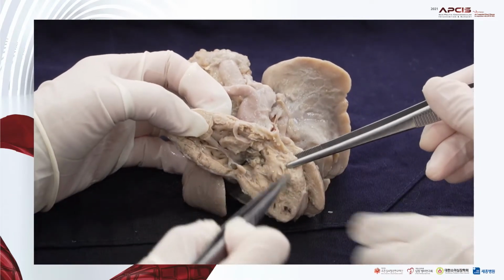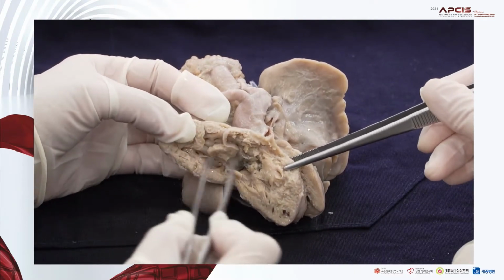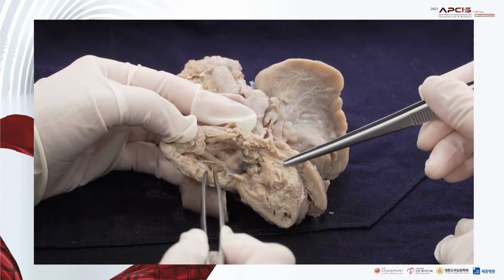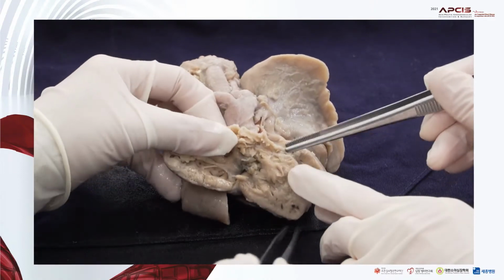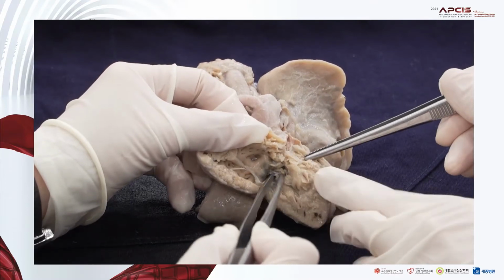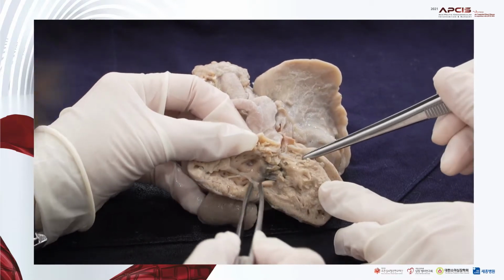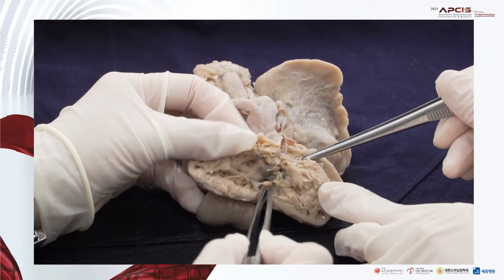So this part is the septal portion, and this is the free wall. And we can recognize very coarse trabeculation, which is characteristic of a morphologically right ventricle here. So here is the tricuspid valve, septal leaflet here, and anterior and posterior leaflet around here.